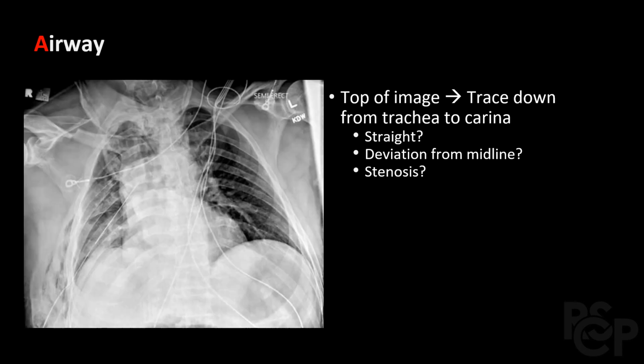Similarly, as I examine the airway for this patient, I noticed that the trachea has deviated to the right towards the lung with multiple opacities. This is an example of a space-losing process in which the trachea moves towards the abnormally appearing lung, especially in the case of atelectasis.